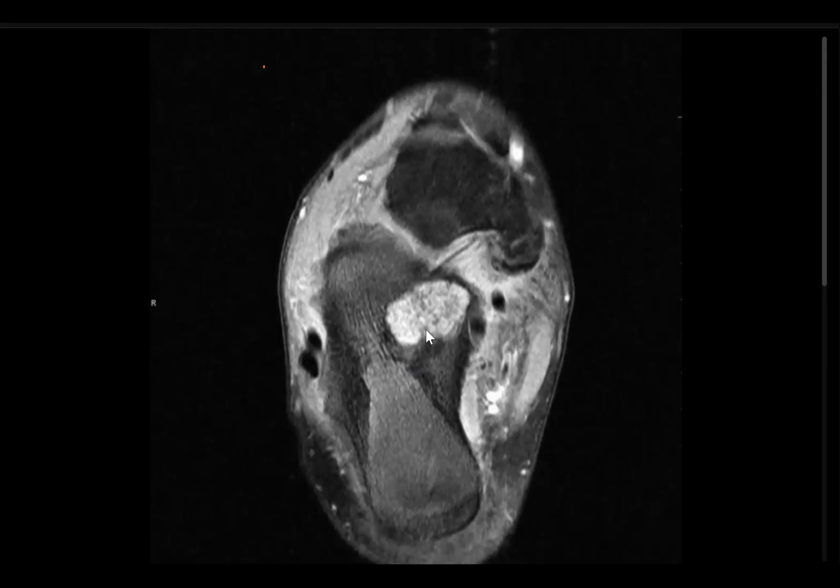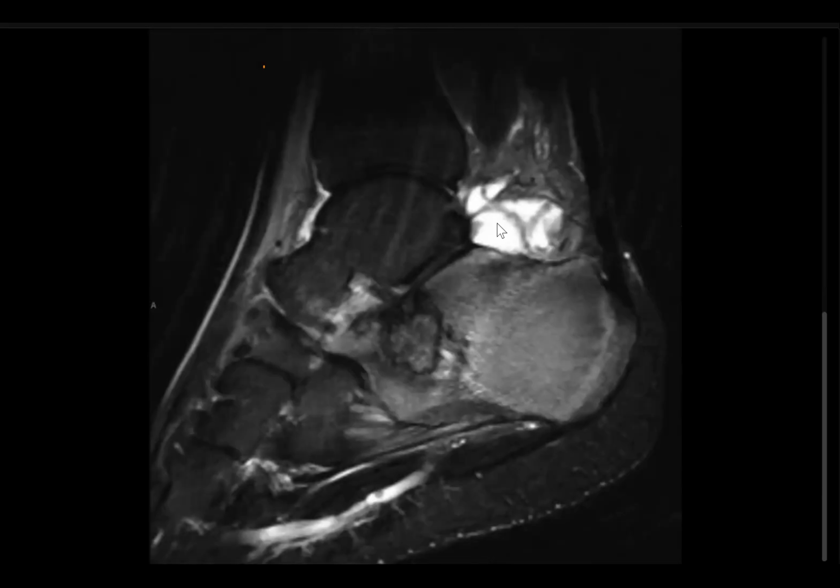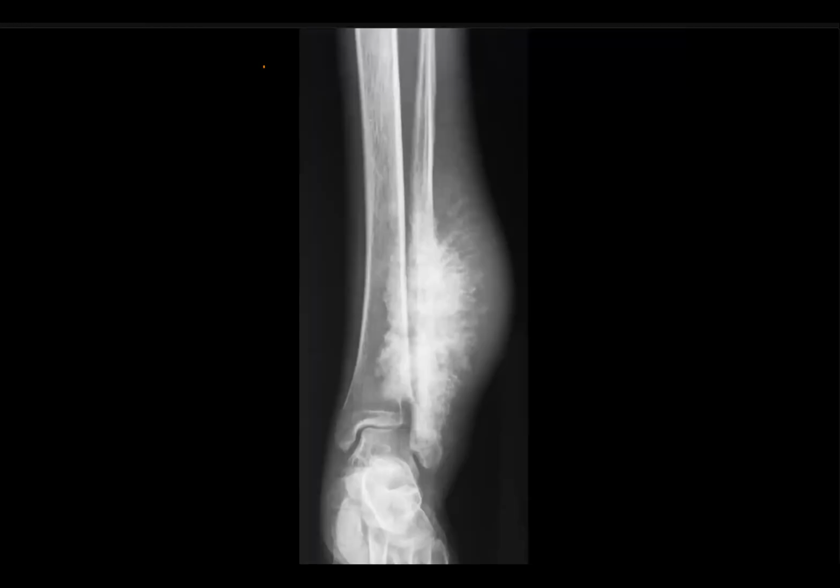in rings and arcs. Is it chondroid? Can it be low-grade chondrosarcoma? No, no, it's chondroblastoma. Okay. Chondroid matrix can be seen in chondroma, correct, but if well defined, it's a chondroblastoma. And this is considered equivalent to epiphysis. So chondroblastoma, with significant edema, significant sclerosis, and even soft tissue edema with effusion in the joint. It's chondroblastoma with chondroid matrix.